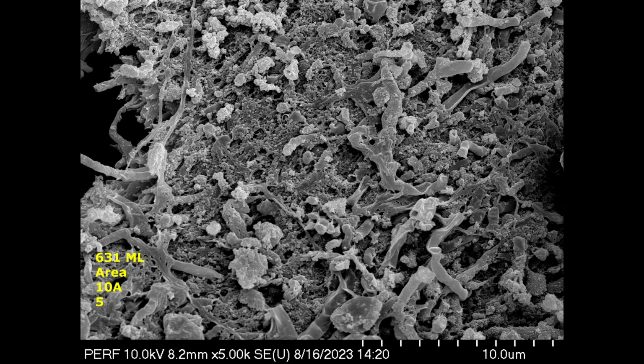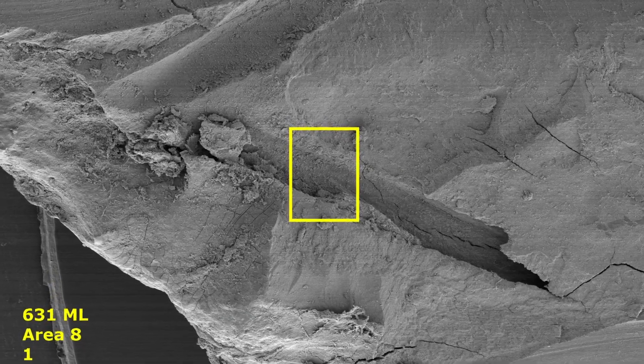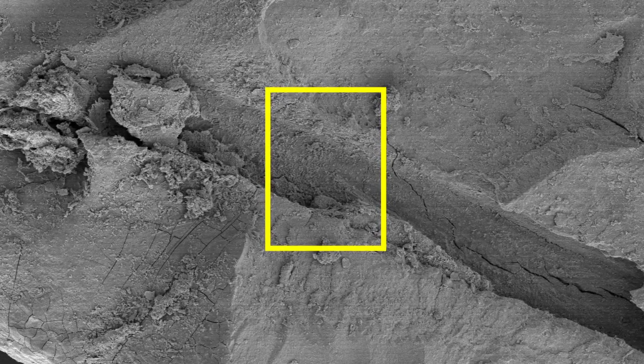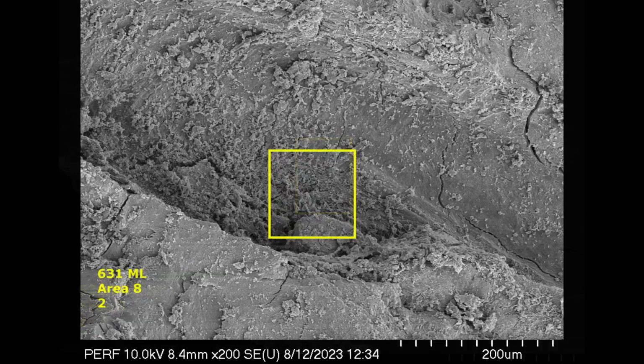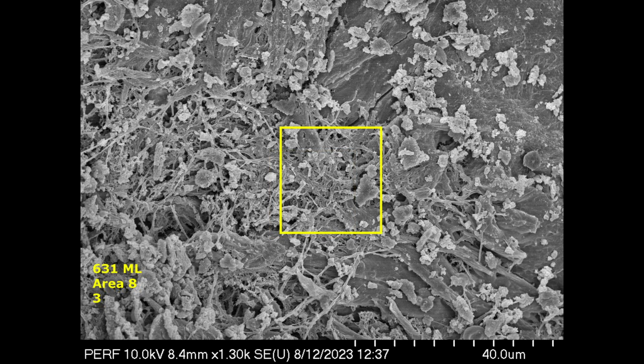It is true that this biofilm does not look healthy, and many of the biofilms look like they've been in a war or at least a hurricane. Further coronally in the mesiolingual canal, it is pretty much the same story wherever you look. And again, it looks like the biofilm does not like the environment they have been subjected to.